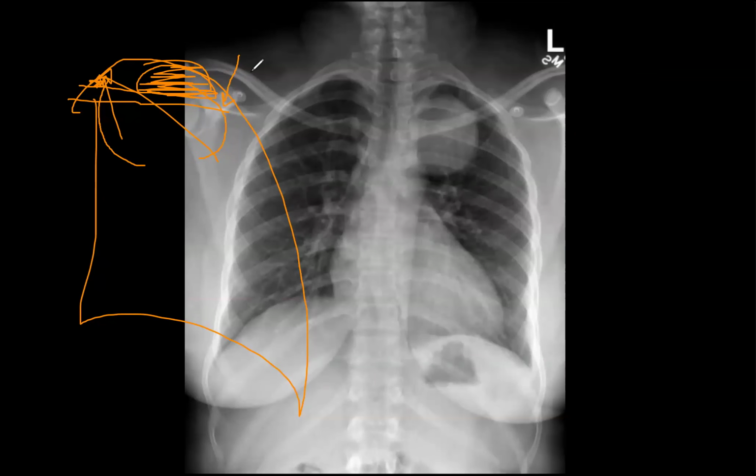This is number one regarding the definition. If it is well defined, it's in the posterior mediastinum. If it is ill-defined, it's anterior mediastinum. What about positive and negative? The cervicothoracic sign is considered a variant of the silhouette sign.